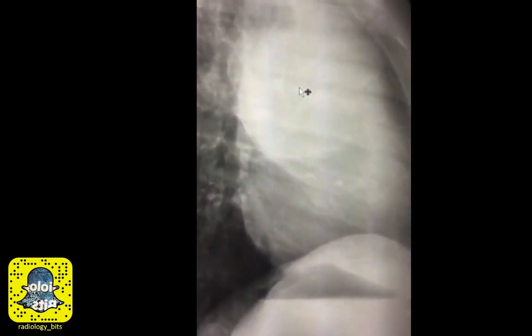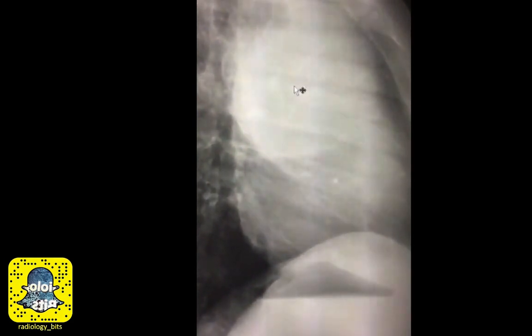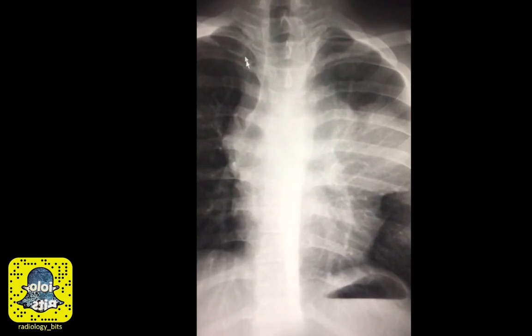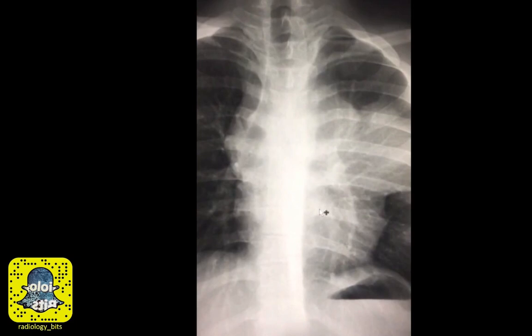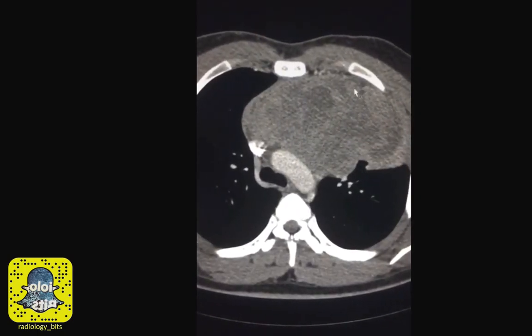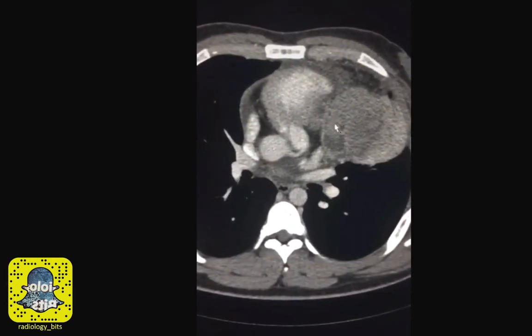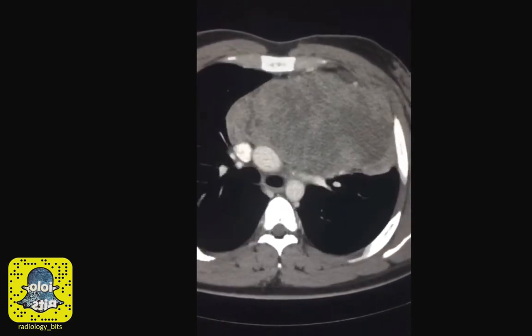Of course, those are the common differential diagnostic considerations, but you have lots of other entities that could exist in this location. The fact that you don't have a thyroid abnormality and the patient is young, you have to consider either lymphoma or teratoma. And for radiology residents and seniors, this is the large heterogeneous anterior mediastinal abnormality, clearly seen on this intravenous contrast enhanced study.